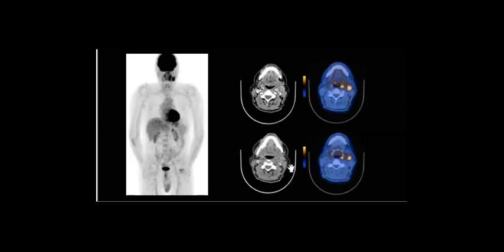And this is a good example of when the PET CT is very nice, because you can see the lymph node and it's easy to detect the lymphadenopathy in the CT. But if you did CT alone, you could not easily detect that there is a high focus of uptake in the left oropharynx. That's why I told you that when you find a lymph node, try to find the oropharynx. Start with it. Maybe it is the primary, if you didn't find any other primary, okay?